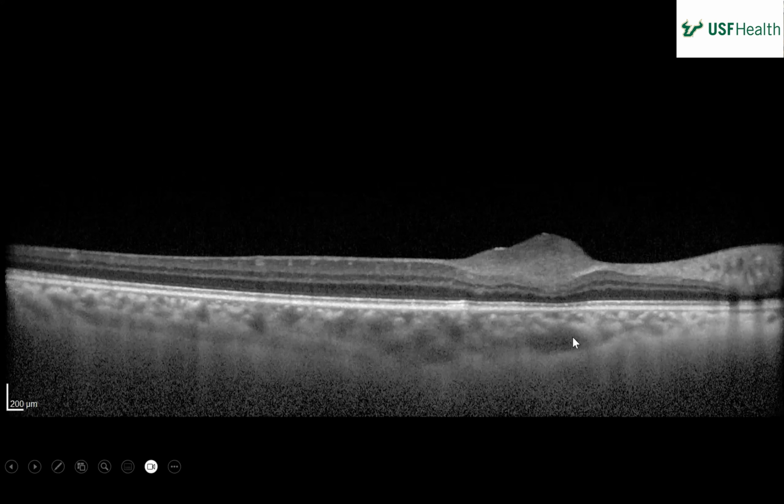All right, so this is helpful. Okay, so this is an OCT of the right eye. At the layer of the inner RNFL, you can see almost this homogeneous kind of protrusion, extending.